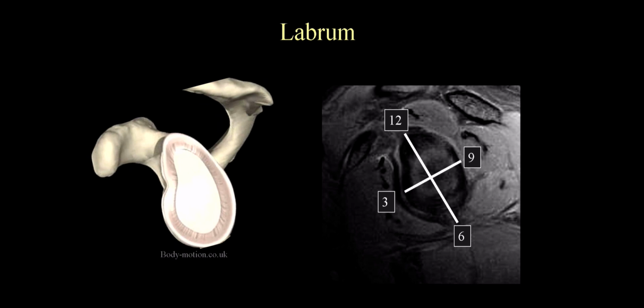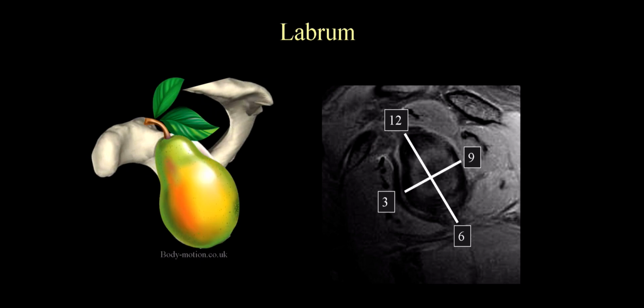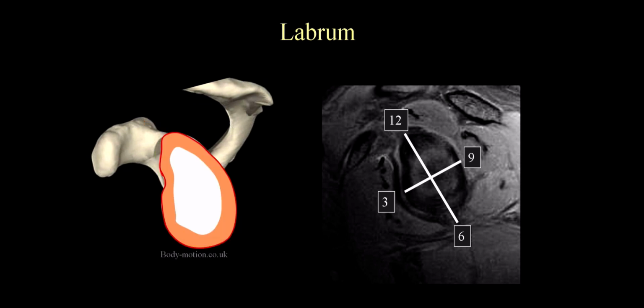It's a little bit confusing, so just make sure that you're communicating. I will specifically say it's in the anterior inferior quadrant, in parentheses, whatever clock position that is. But you want to make sure you realize the top of the shoulder is going to be the 12 o'clock position, and it's not straight up in the gantry. It's relative to the biceps anchor.